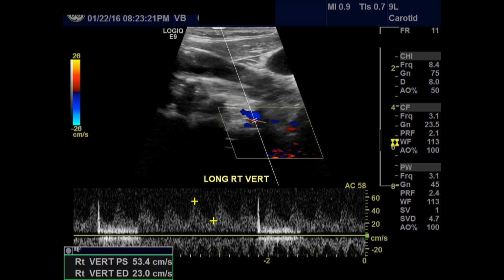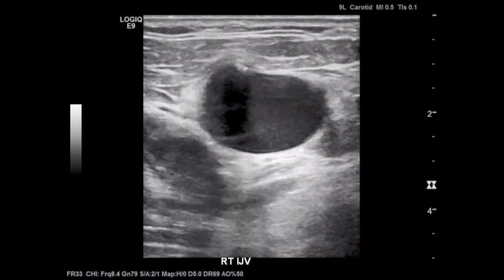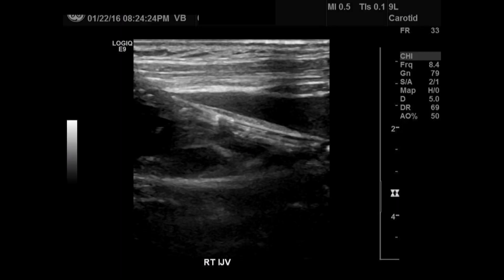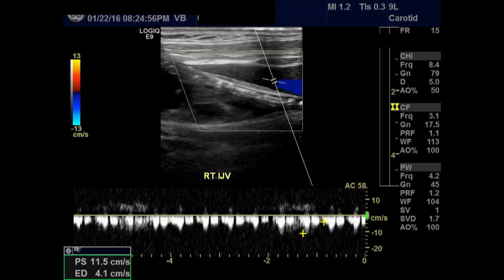Here's the vertebral. This is interesting. So snoring almost has an emboli artifact, but again, emboli would be randomly appearing. This is the same shape. That's why it's more based on the breathing and sitting on a zero line. Vertebral is antegrade towards the head. You see the clot again, and you see the clot in IJ. And one more image on IJ with a line in it.